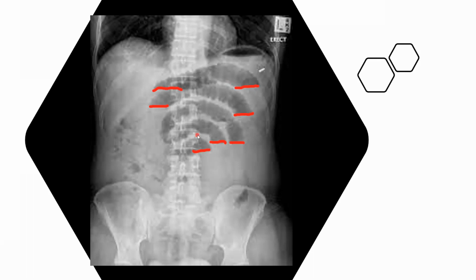He's got all the classic symptoms. The other things that you need to look out for now, of course, are perforation. And perforation will very often lead to sepsis. You may get air under the diaphragm. It just depends on how big the perforation is, but you'll generally get air under the diaphragm. If you lay the patient in a lateral decubitus on this side, you may see air over here on either side of the abdomen as well, and of course you go on your symptoms.